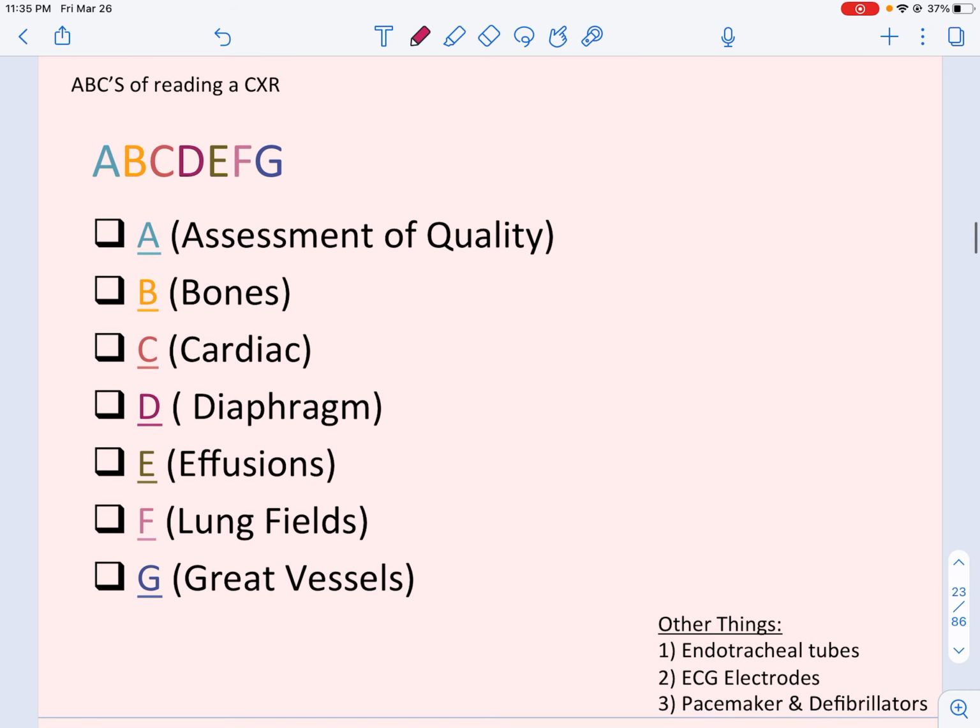تمام؟ هنا في rules. Actually I found it much easier. It's called ABC rules for reading chest x-ray. هذه rules has 7 steps ومرة سهل إنه الواحد يتذكرها علشان هي just alphabetical from A until G. So 1, 2, 3, 4, 5, 6, 7. تمام. أي chest x-ray you handle it, you need to assess all of that. في البداية حياخد وقت الموضوع, but once you assess many chest x-ray and follow these rules, it's gonna be quick.